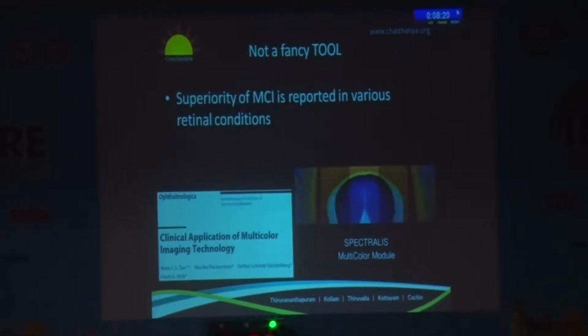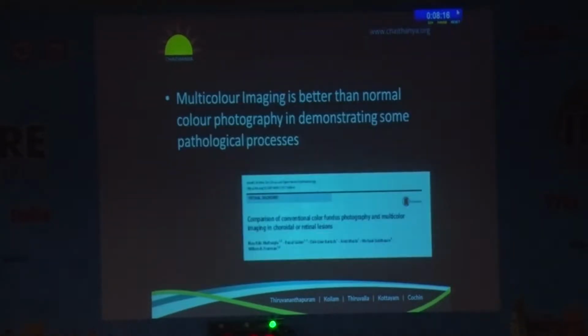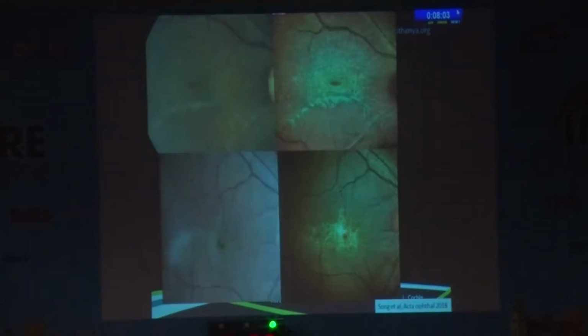The superiority of multicolor imaging is reported in various retinal conditions. Now I'll be showing you some case examples trying to prove this point. Multicolor imaging is believed to be better than normal color fundus photography in demonstrating some pathological processes. Now look at these examples.